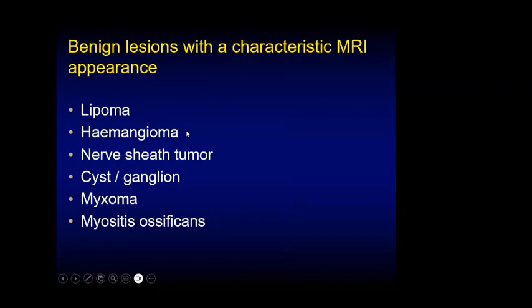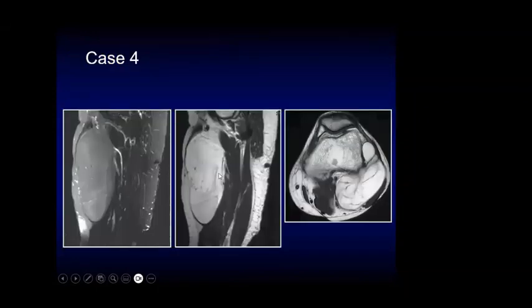I know this is a large tumor, with no evidence of malignant degeneration. This is still a lipoma.